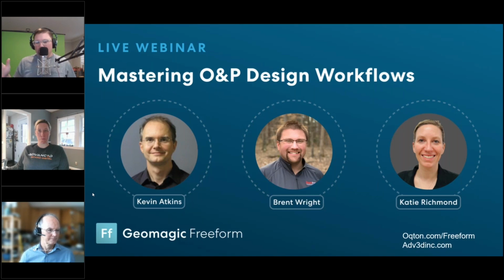Okay. And so I don't want to get into the weeds on the Freeform Plus, and this is the beauty of working with the team at Freeform. You start with Freeform, you get better and better, and it's not that you're going to hit a ceiling. People have been very successful just in Freeform, but there are some things in Freeform Plus that as you get better in Freeform, you may want to bring in assemblies like STEP files and that sort of thing into your Freeform space, which would require Freeform Plus.